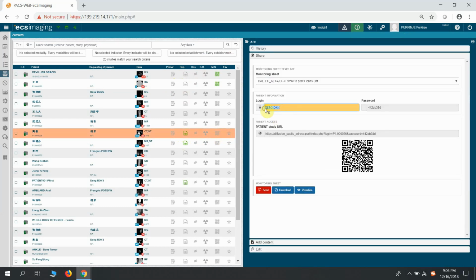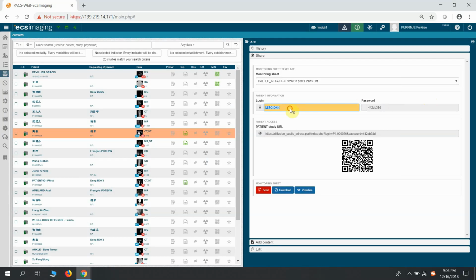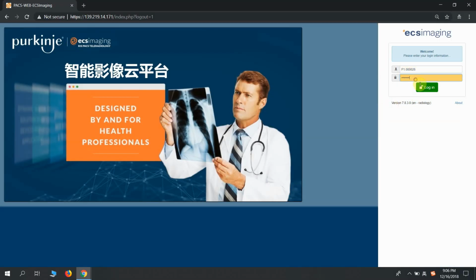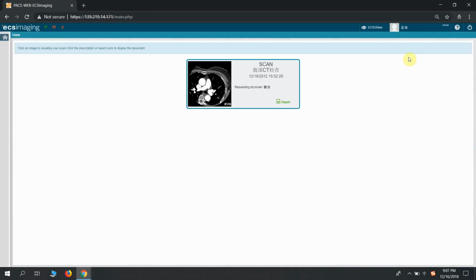So I will try a different one. I log out of the system. I select I am a patient again. I copy. And then the password. And we will see this patient's report. This patient's images and reports are ready. Okay.